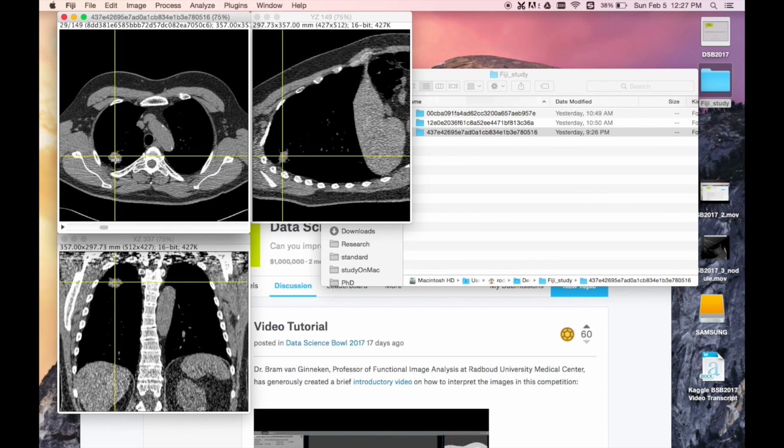Here you can see the Z dimension. In the Z dimension, you can see the slice. Here is a nodule. In YZ, which is the X dimension, you can see the nodule, and this one in XZ. But this is not our focus today.